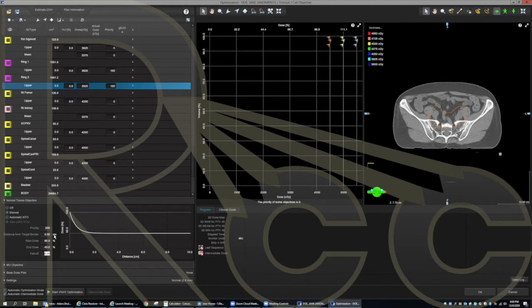This has been more sort of experience. I found it to work for me, so I've just left it. If you want to know the dose fall off, how long it takes, you can always do an optimization, use your profile measurement tool, measure a profile of your dose fall off, visualize what that dose fall off is, and plug in this number until you get that similar dose fall off. It could change from site to site, but I sort of use this standard right here.